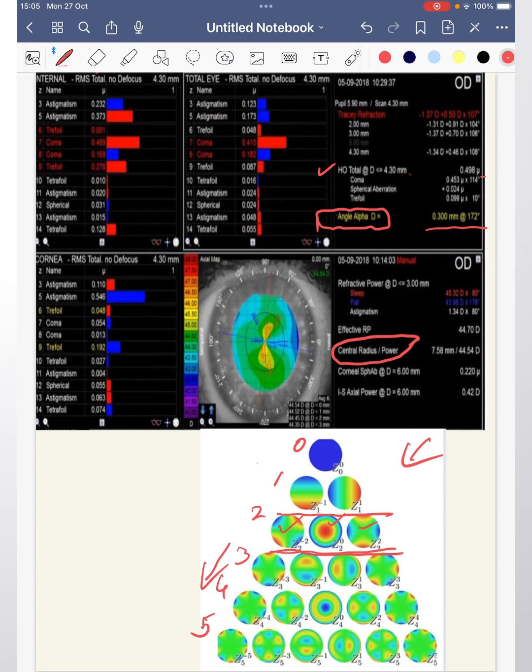You get this value by measuring the anterior cornea, like the keratometers do, and you get a total power of the cornea by applying the fictitious keratometry index of 1.3375. So you measure the anterior cornea and get the total corneal power without measuring the posterior cornea, taking into account the keratometry index of 1.3375.